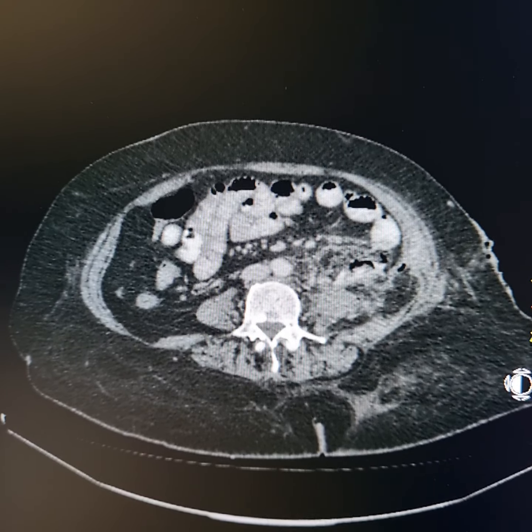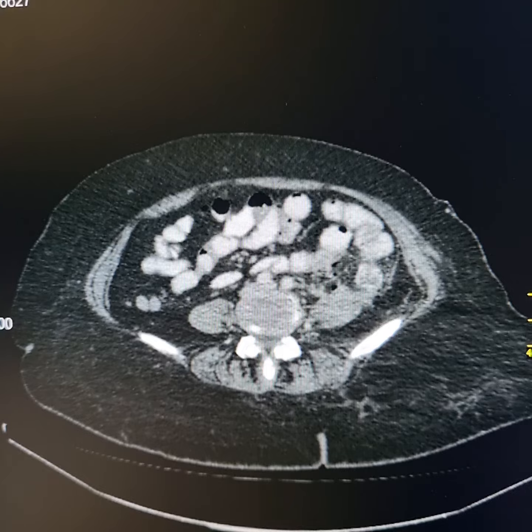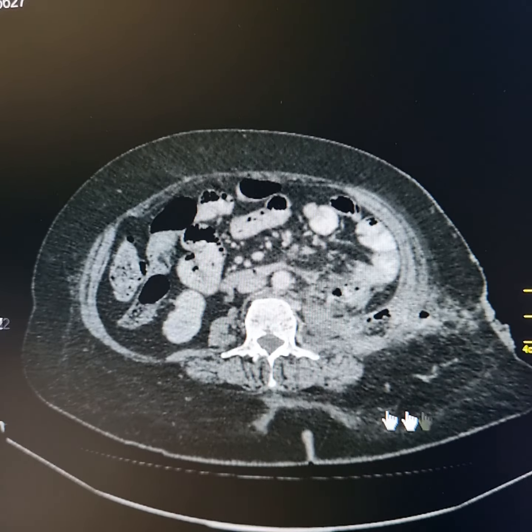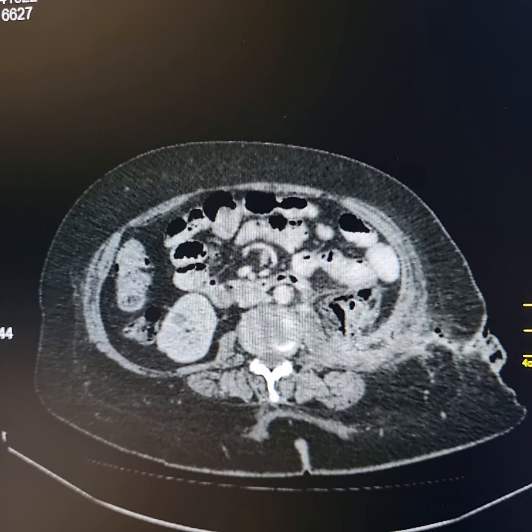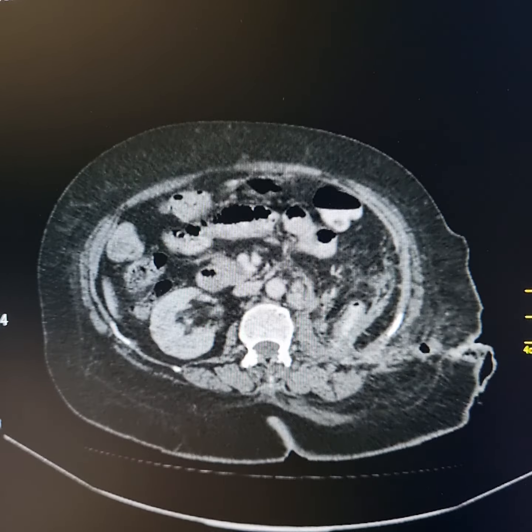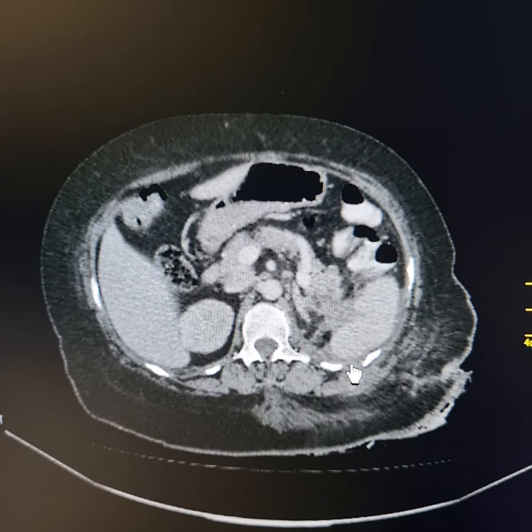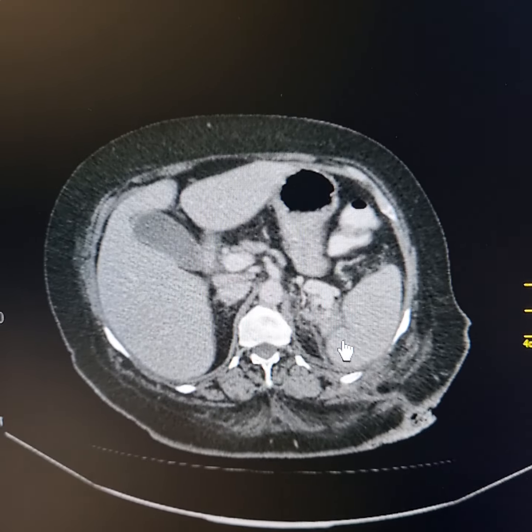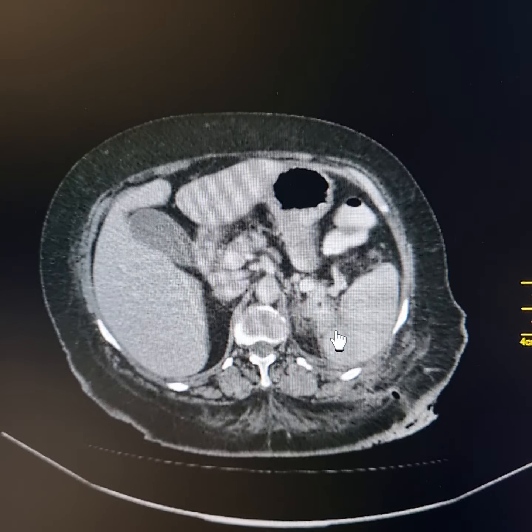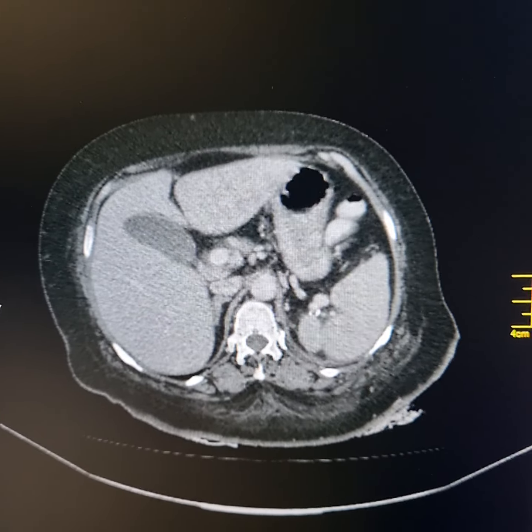Marked infection and inflammation are present in this region of renal fossa. Left psoas muscle is enlarged. Quadratus lumborum muscle is enlarged. And infection and its inflammatory reaction spreads upwards along the posterior surface of the spleen, involving the tail of pancreas as well.